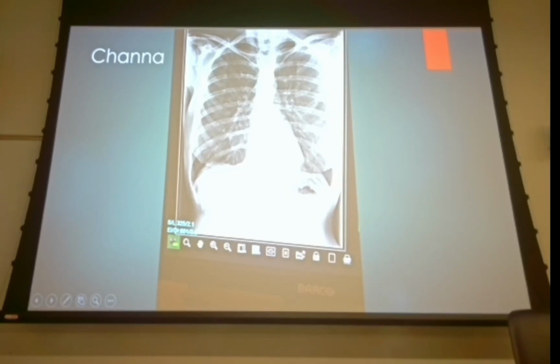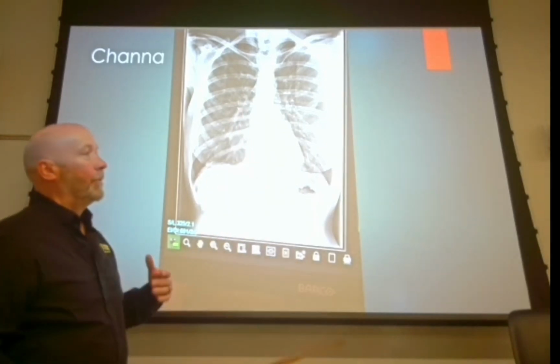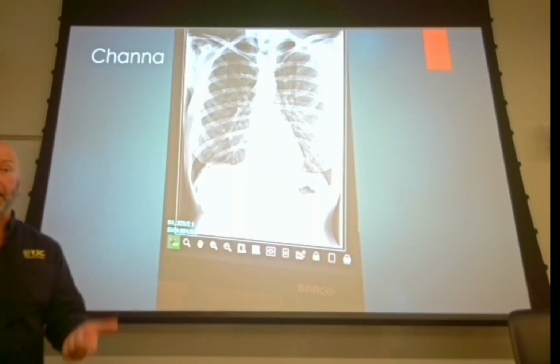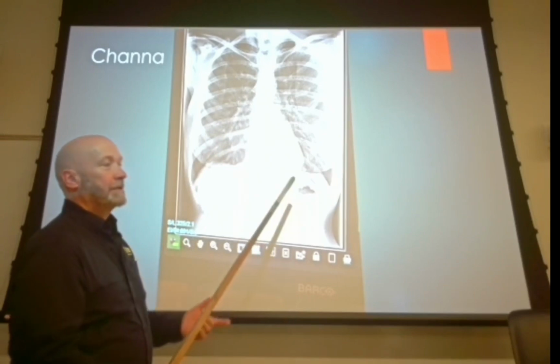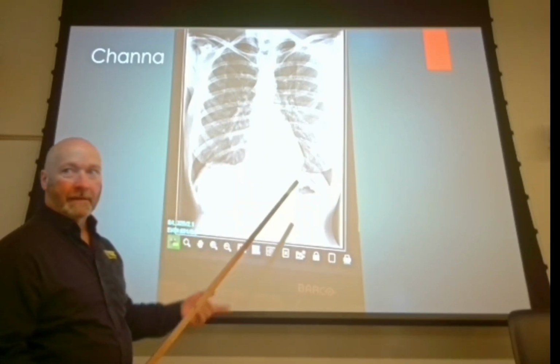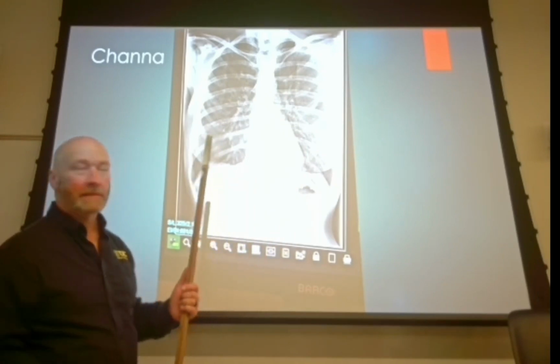While I'm thinking about it, sometimes you'll see something on an x-ray that you think is scoliosis, but it's not truly scoliosis. Some people call it compensatory scoliosis, some people call it dominant hand scoliosis. It happens most of the time in people who carry heavy things, so you've got your farmers, your construction workers, things like that.